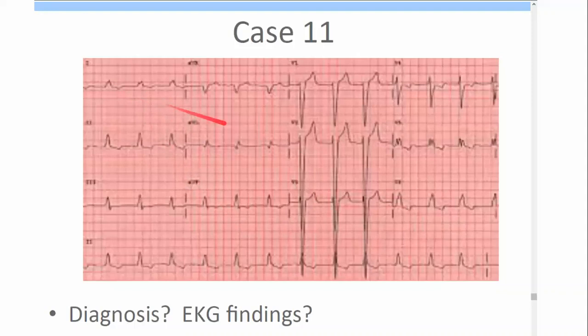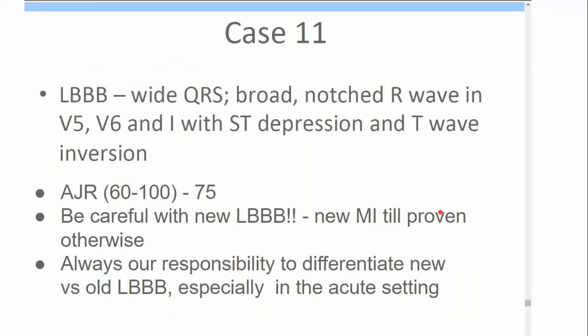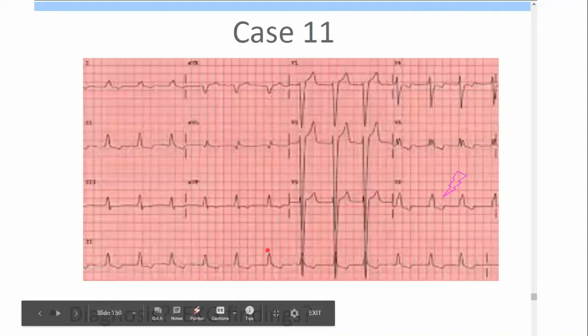But what's going on? We're supposed to look over here. So what does this mean? Well, it's big. Is it ventricular, or could it be a bundle branch block? Do we see our RR prime pattern? No. But we see a big QRS over here. What we're supposed to see is a left bundle branch block because it's got a wide QRS. Now, they're calling this accelerated junctional rhythm. Why? Because there are no P waves. This is a really, really cool EKG.